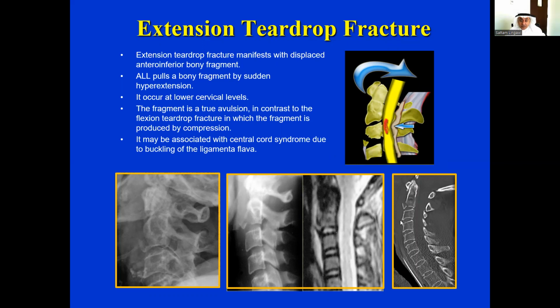You can see a tiny fracture in here. You can see a larger one in here. These are the extension teardrop fractures.